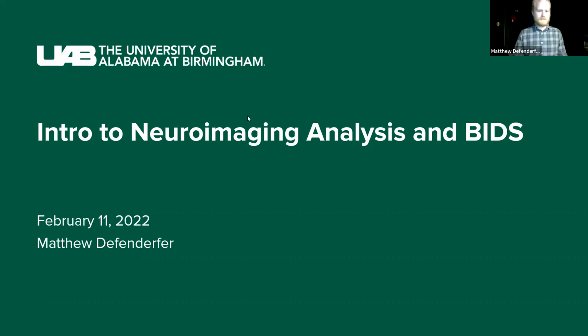Okay, so like I said previously, I am Matthew Defenderfer. I work here with CINL and Research Computing. And today I'm going to talk with you all about and lead you through a little example about BIDS organization, and then move quickly into a little bit of fMRI prep, so pre-processing some MRI data that we have available for you.